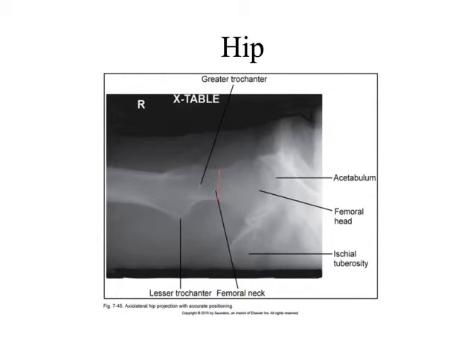So we're familiar with this position probably. I mean, this is the one where we used to say, aim right at their junk. That's what we always said in post-op, literally. And then get a little angle on your central ray, and then an angle on your image receptor, and blast the heck out of them, basically. It requires a lot of technique because you're typically using a grid.